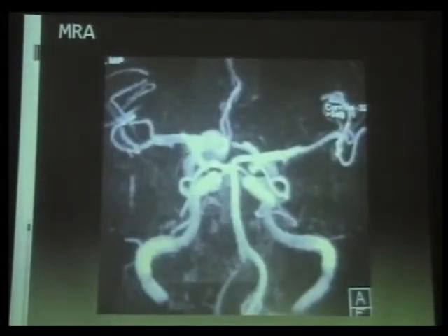The 2 imaging studies for angiography that have markedly reduced the number of angiograms that I order are MRA and CTA. MRA is MR angiography. Remember we talked about the flow void. So rapidly flowing blood on MR generates no signal. That's flow void. But you can find the reverse, the signal, on MRA. So we're going to take that flow void signal and make it bright. Here is an example of an aneurysm seen on MRA.